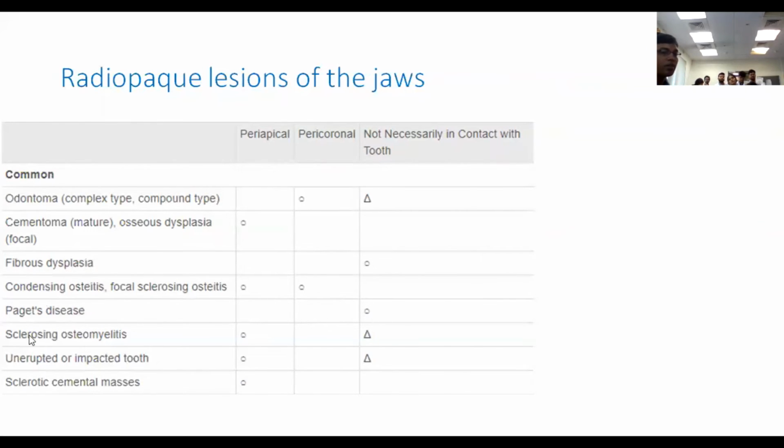And sometimes an unerupted and impacted tooth can be there, and it can be misinterpreted as some tumor. Okay, so it is an unerupted tooth, dysmorphic, and sometimes people call it a hamartoma. It looks to be a tumor in that location.